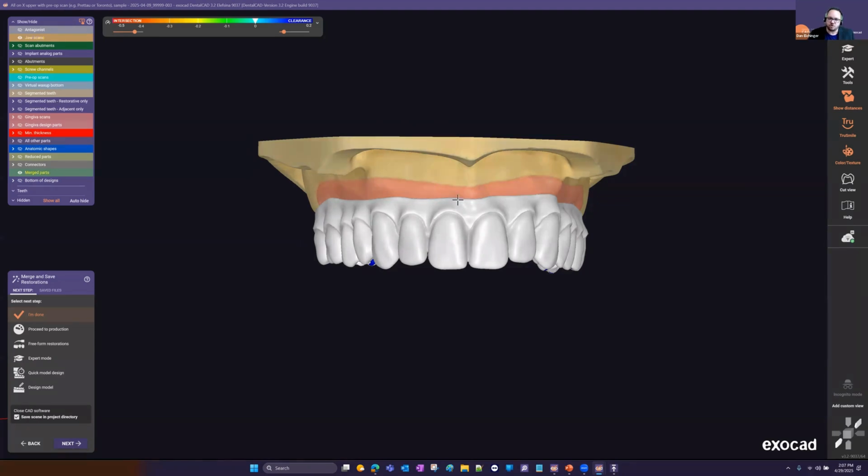Or you can hold Control and Shift while you're scaling something, or just Shift. So depending on what tool you have selected, play with holding Shift or Control and Shift. That's within your tooth placement.